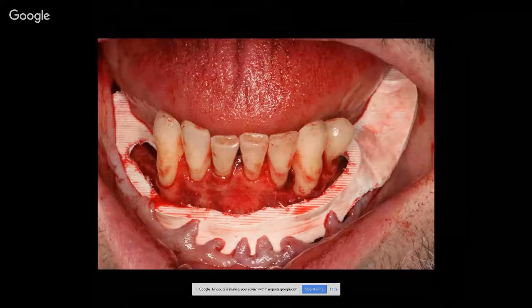So this is the picture of the bone reduction guide. This material I no longer print with. I'm now printing with Gen Clear, that's lowercase n, capital G, lowercase en, and it's made by Color Fab. To get this to seat properly and to seat all the way is a little difficult. This is 3 millimeters of thickness, and that's a default on Blue Sky Bio Plan.